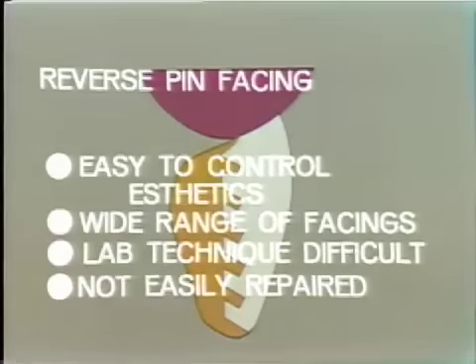Just to summarize the main characteristics of the reverse pin facing, it's easy to control aesthetics like it is with any preformed facing, because you can select the facings ahead of time, grind them, adjust them, and try them in the mouth. It opens up perhaps the widest range of porcelain facings for use in bridge work, because you can use any denture tooth or any bridge type of facing in this technique.